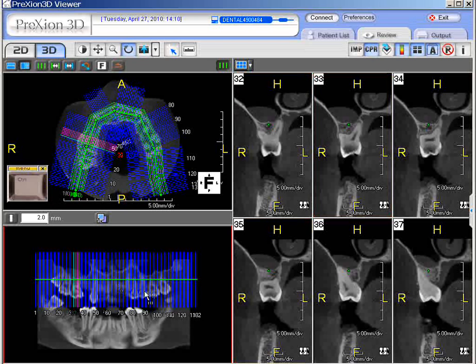Now, the panel image, this number 2 is going to be your thickness of the panel. One can change that. This is how. The thickness of the section, there's two ways.